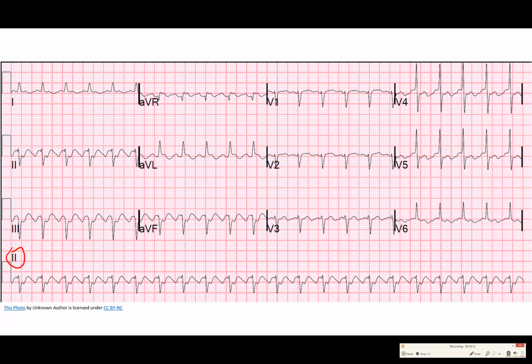You can see that there are definitely QRSs and there are Ts. The question is, what is this thing that you see consistently right before the QRS? Is that a P wave? And that's understandably difficult to say, especially if you're not used to reading ECGs. Some of you might say, yeah, that looks like half a P wave. Some of you might say that just looks like another T wave, or that just looks like some random bump. So we're going to start out by saying it's questionable if we actually see P waves, right?